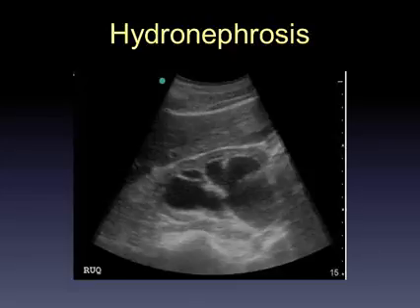Now I've put up there a slide of some alarming looking severe hydronephrosis, but we'll begin with the mild hydronephrosis and talk through the grades with you. It's important to point out that ultrasound is actually generally pretty good at looking at hydronephrosis, even mild grades, with quite a good demonstrated accuracy compared with CT scan.